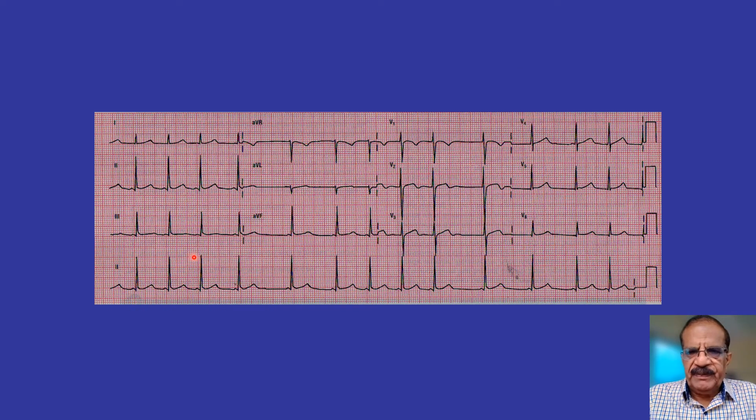How about this one? At first glance, it is certainly not bradycardia. You see, it is not bradycardia. What is it? For the rhythm, we see the continuous strip, which is this one, limb lead 2. If you scan this lead from this side to this one, one thing you should immediately appreciate is that RRs are not regular. So there may be some arrhythmia.